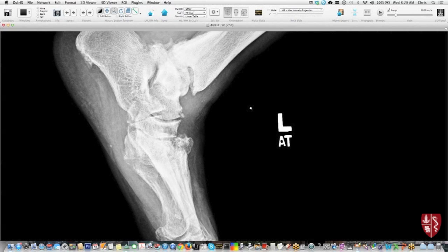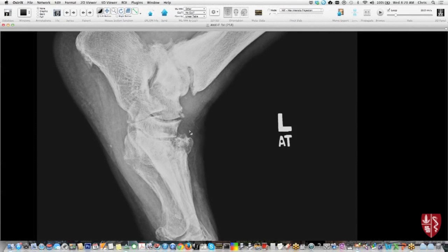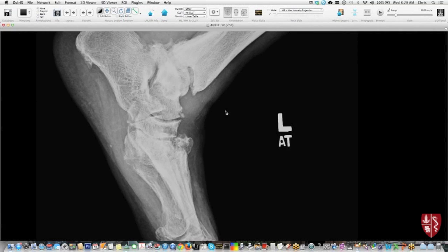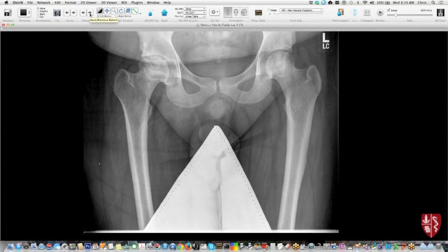This patient also has involvement of the midfoot, and it's a little bit hard to see here, but there's arthropathy involvement here, and the foot's collapsed down, so both the ankle and the foot. So virtually always those patients are going to have diabetes. They might have something random, like sometimes a syrinx or congenital insensitivity to pain that leads to this type of insensate predilection for arthropathy.